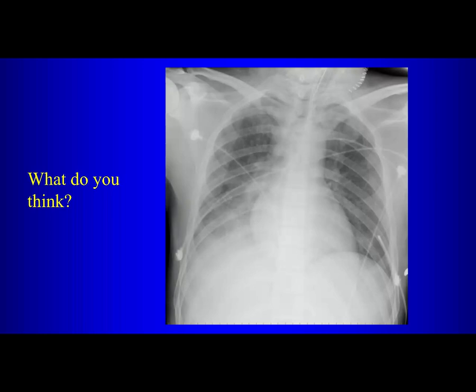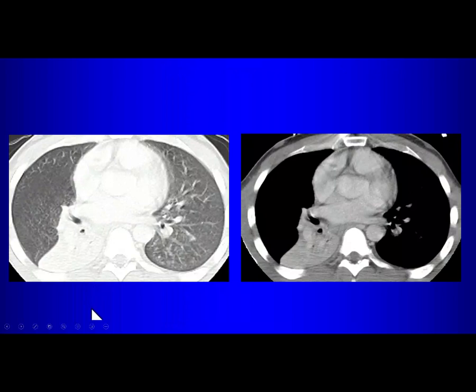Well, does that lung look smaller than the other side? Does the heart look like it's shifted towards the right? Yes, it does. So there is volume loss there. So at least some component of this is right lower lobe atelectasis. Okay, but it can be very difficult to differentiate right lower lobe atelectasis from pneumonia on the chest radiograph. You can also have the same problem on CT. In this case, on the CT though, we can see that it's clearly collapsed, right? Because here's the fissure displaced posteriorly. So we're looking at atelectasis there in the right lower lobe.